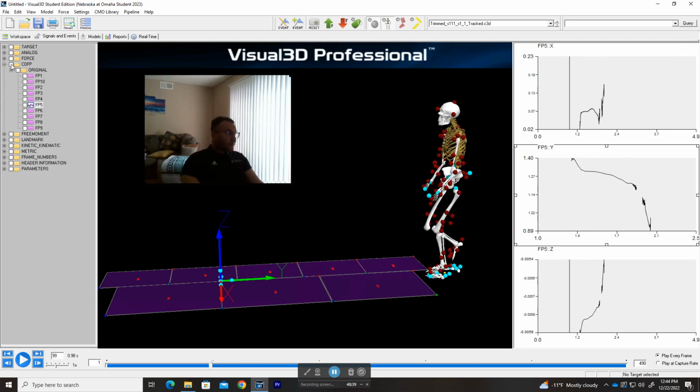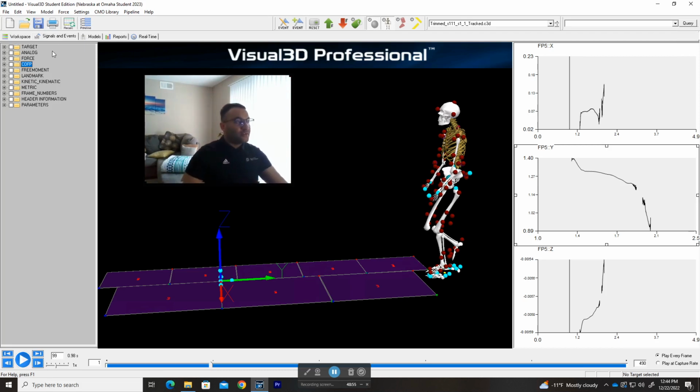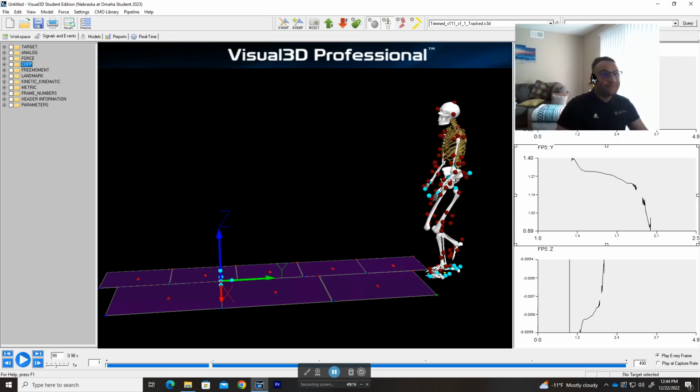It's very, very powerful when you're trying to be creative: visualize your data, try to analyze specific data, and you can also graph them here and see if it makes sense or not. The first thing you need to do in biomechanics is to visualize your data and make sure it makes sense. That's why I don't like to run my pipelines automatically, because it leads to more error. But whether you do that or do it more manually, you have to go back and check your data.